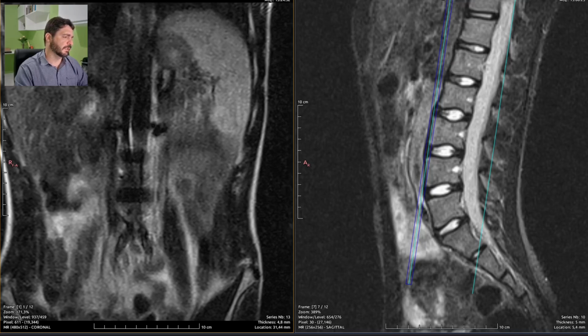So it says he has pain on the lumbar spine for a long time. He's 14. Come on. Okay. Someone 14 years old has chronic lumbar pain. Makes no sense. So people are just crazy. I like to go to the doctor to complain about things they have not experienced.